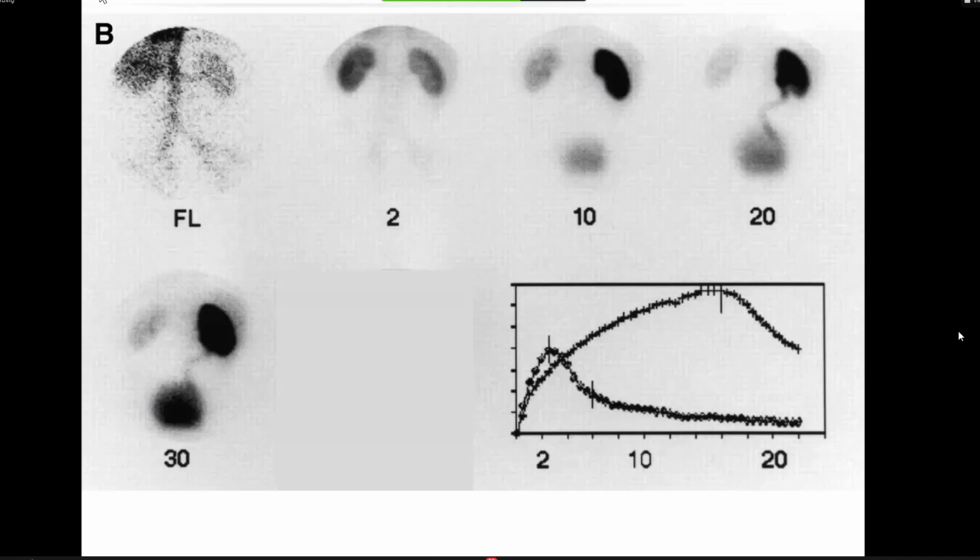And also remember that sometimes the visual impression can be very challenging. When you mathematically graph it, you are more confident to call it. Visually it still looks like a significant amount is still there, but you always get a doubling of your visual impression by looking at the plots too.